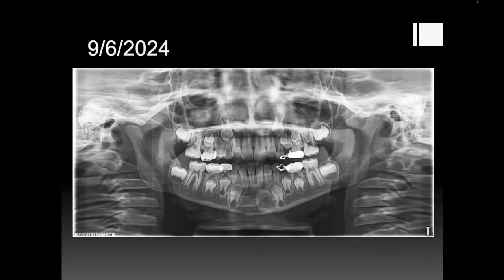Let's talk a little bit about the mandible. What are we seeing there? Anything you want to keep an eye on in the mandible, and why? There's a slight mesial tilt to the lower canines. Okay, on both of them, for sure. Yeah. Yep. And looking at the mandibular left canine there, what else do you notice about its relationship to the primary canine? Besides it being a little bit mesial, which I agree.